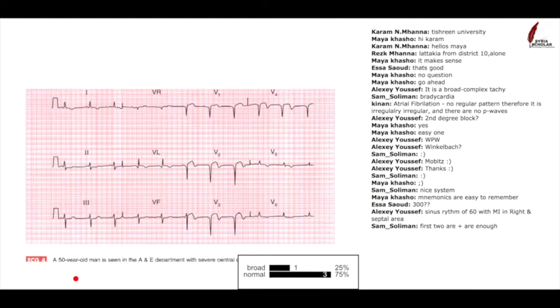Are they too tall, or are they normal? So are the QRSs tall or normal? So they are normal, that's true. So if you add up the height of V6 and you add that to V2, this is about maybe 3, maybe this is 4, this is about 1, so 1 plus 3 is 4. We don't have any hypertrophy. V1 is negative, so it's not right ventricular hypertrophy either, and we don't have right bundle. So there's no hypertrophy here.